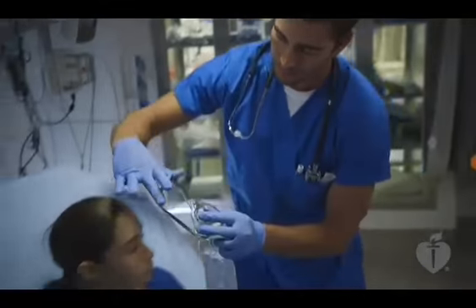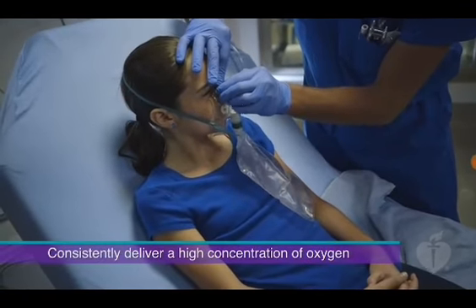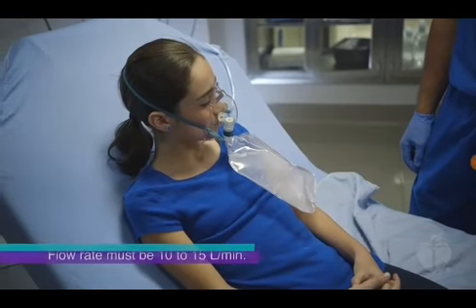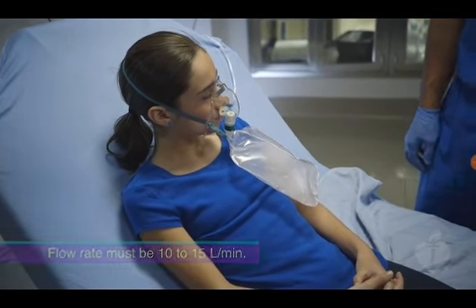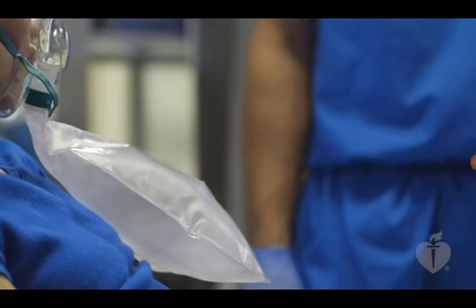A commonly used high-flow system is the non-rebreathing face mask. One advantage of this device is that it allows you to easily deliver consistently high concentration of oxygen approaching 100%. Non-rebreathing face masks are always connected directly to oxygen. The oxygen flow rate for the mask must be at 10 to 15 liters per minute. The flow rate should be adequate to keep the reservoir bag partially expanded.